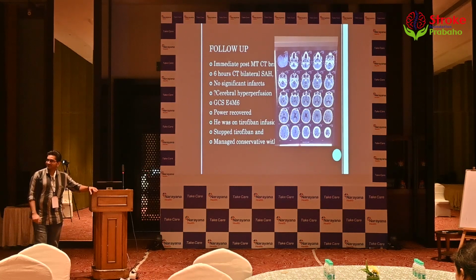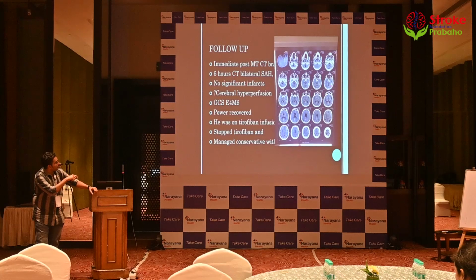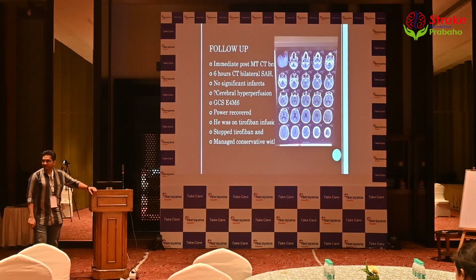SAH? And secondly, it has extended to the temporal region also, right? Yes. This is that area you're talking about, laterally placed. So you cannot go with your microcatheter and your microwire that far.